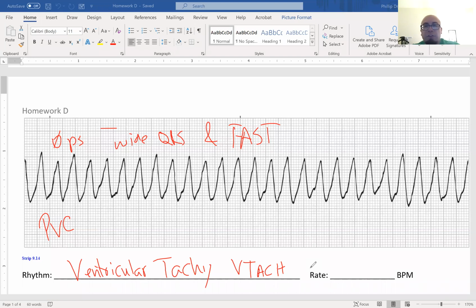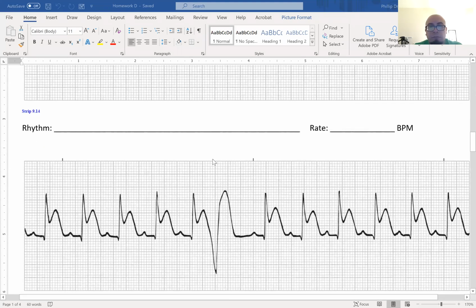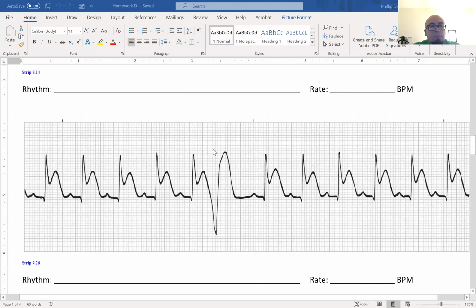All right, and then you calculate your rate. I think this one's like 187 or something like that.